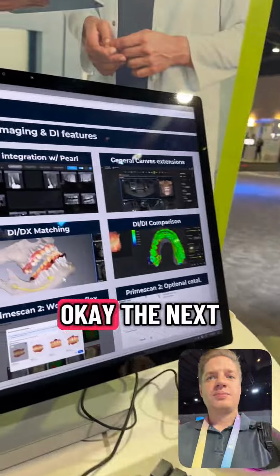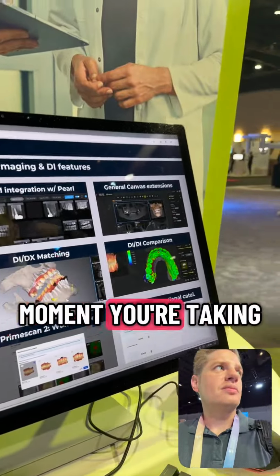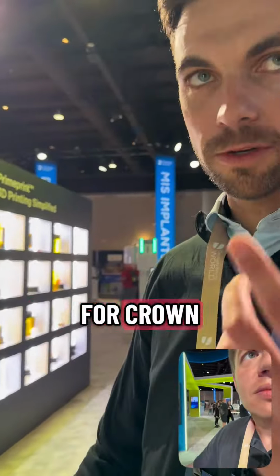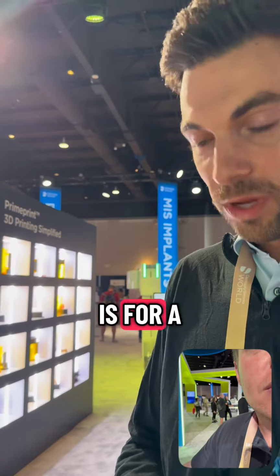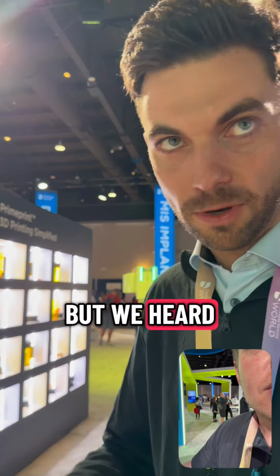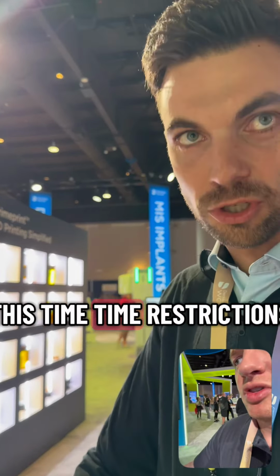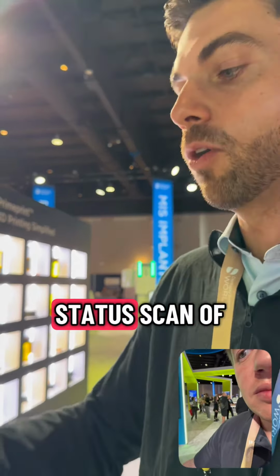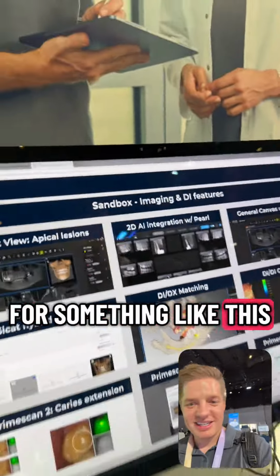Yeah. Okay. The next one is increased workflow flexibility for the PrimeScan 2. At the moment, you're taking a status scan, then for example for a crown, you're prepping the tooth, and you want to then take a treatment scan. Currently there is a certain time limitation on which status scan you can take as a reference. It's 4 weeks at the moment, but we heard the feedback from the markets. We removed this time restriction, and right now you can take any status scan of any intraoral scan of this patient as a reference scan. So good. I've been hoping for something like this.